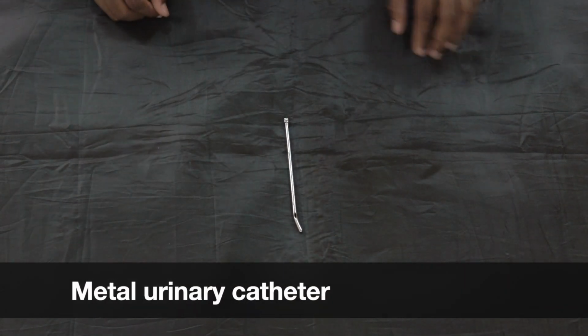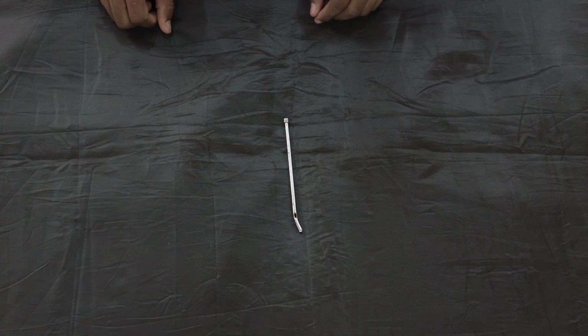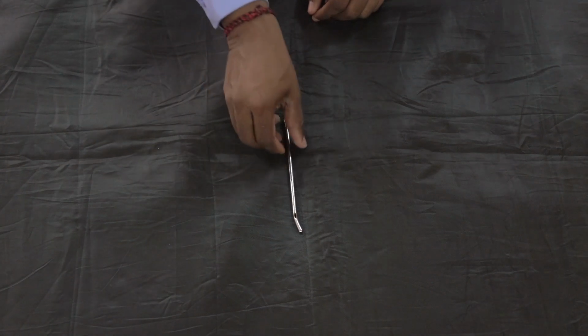Finally, this is a metal urinary catheter, or we can call it an in and out catheter, which is actually used to empty the bladder before the vaginal surgery.